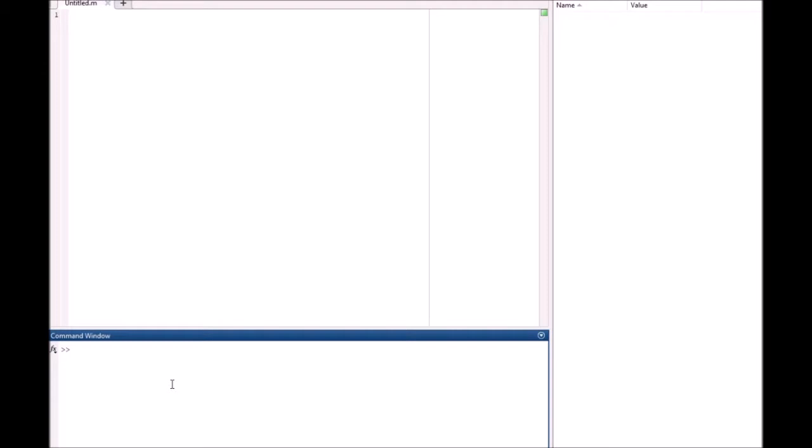Hey everybody, I just thought I'd do a quick video with some basic signal processing type stuff. This is really low level, so if you have some experience with signal processing, data science, etc., this is going to be kind of entry level.